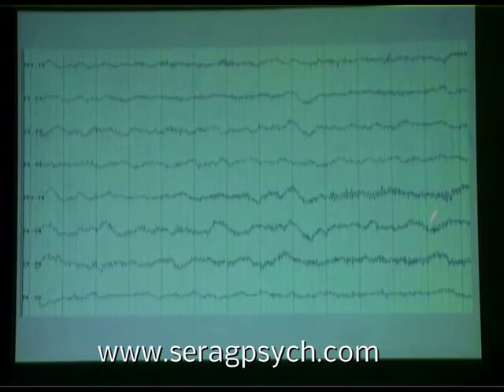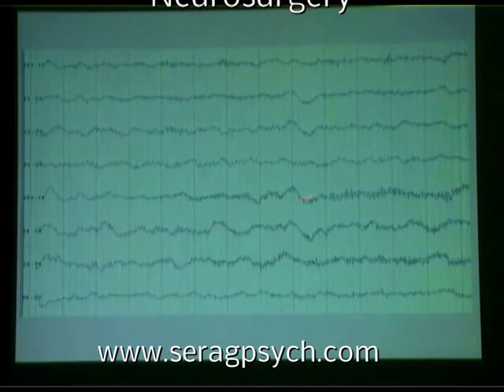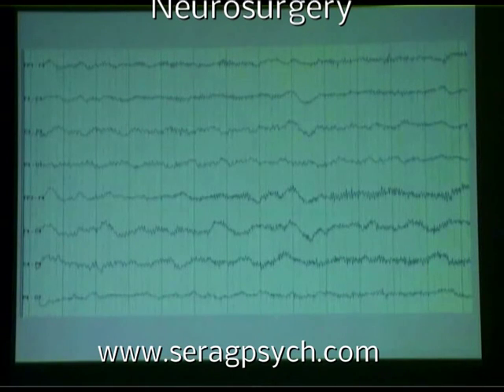And here, it's also consisting of beta activity in approximately the same frequency range, looking very much like the interictal, but this is not normal for this patient's right side. Interictally, he doesn't have this much high frequency activity. He has less here than in the left hemisphere, and therefore this is a seizure because it's a new phenomenon from where it is.